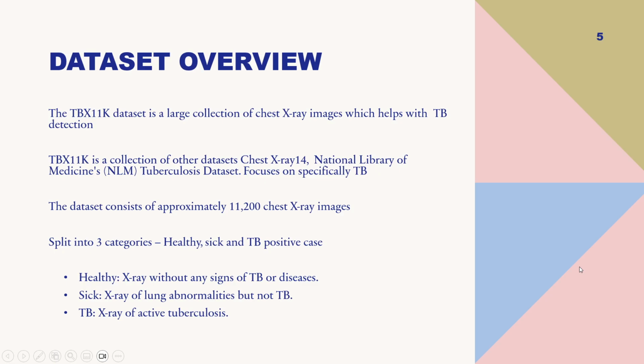So in this dataset, I've split it into three categories. There's healthy lungs, so it is a chest X-ray of a healthy lung. There is another category that is sick, which is sick lungs but not TB, and then TB positive cases.